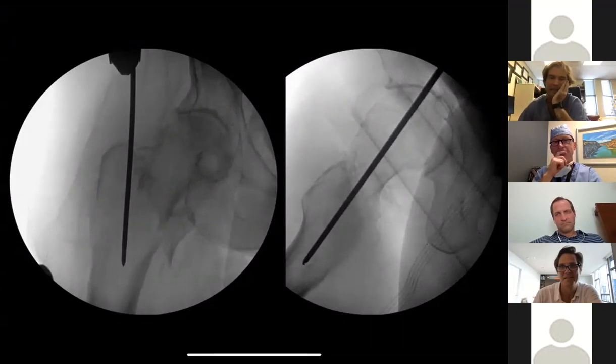Yeah, it's distracted. So doesn't that depend on the beam though, right? The angulation that you come in with, right? So now we've uncovered, remember the greater was smashed. And so I felt as though we had just uncovered more of the neck with this x-ray view. Okay. May not be right though, right? I don't know.